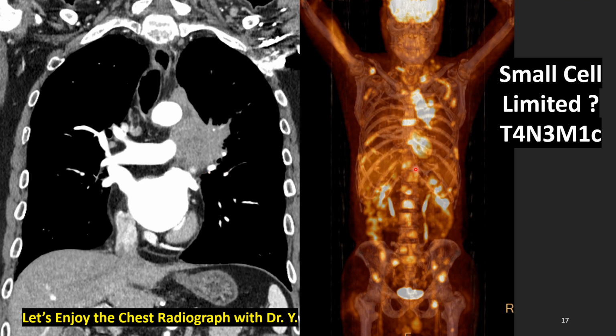But look at this PET-CT MIP image. Large, conglomerated, strong hot uptake of the tumor mass here, and almost everywhere shows multifocal hot uptakes. Almost the whole body is showing us metastasis. So much tumor burden of small cell lung cancer. In TNM staging, this is T4, N3, M1c staging, stage 4, terminal stage.